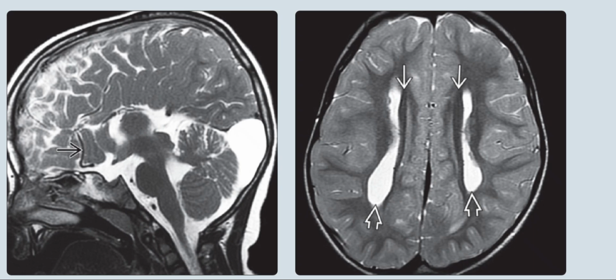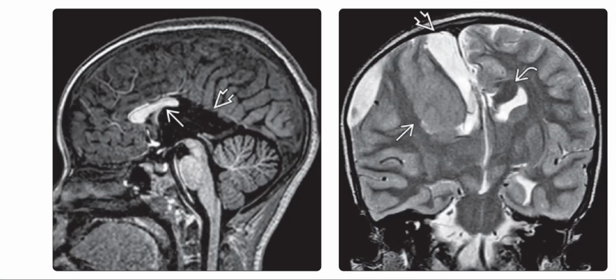The image on the right is the axial T2-weighted MRI sequence, and it's the same case. It shows the characteristic parallel non-converging lateral ventricles, which are seen in corpus callosum agenesis. Heavily myelinated Probst bundles are seen just medial to the lateral ventricles. So, some more images from callosal dysgenesis.